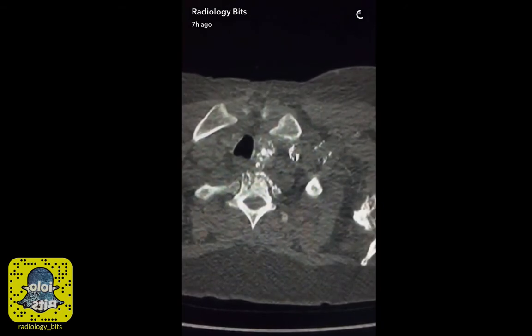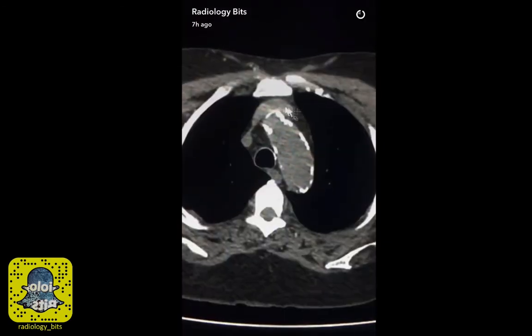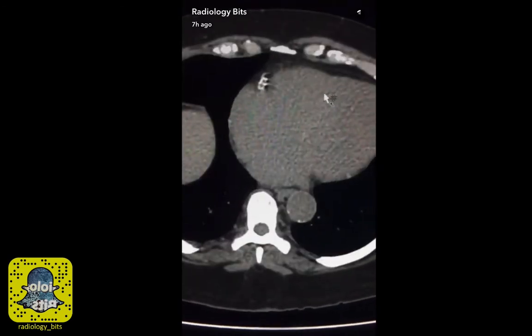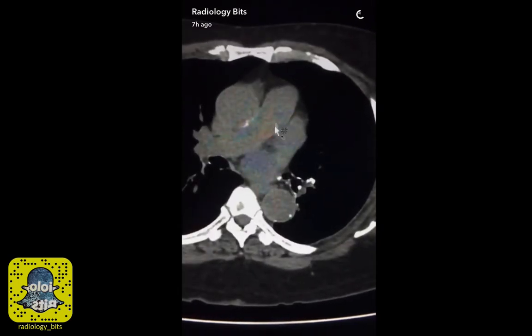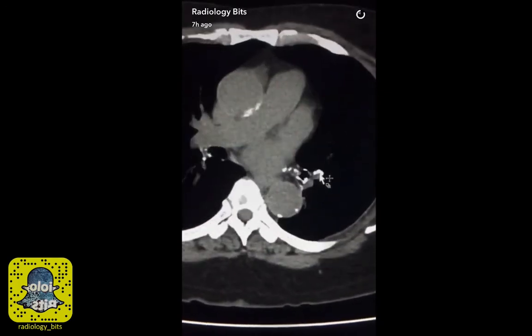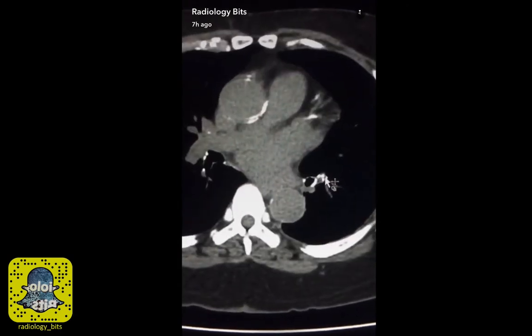That part of the stent has actually fractured and embolized into the venous system, traveling in the left brachiocephalic vein, then the SVC, then the right atrium into the right ventricle, subsequently into the pulmonary artery, then the left main pulmonary artery, and finally being stuck and residing within a segmental branch of the left-sided pulmonary arterial circulation.